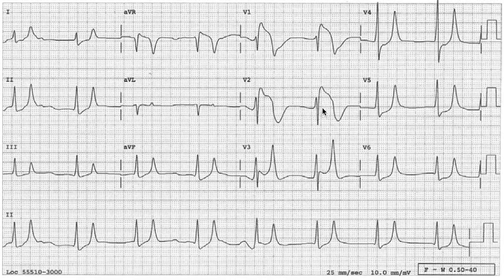This patient could be coming with acute renal failure and increased potassium. So the last thing he needs you to do is to inject him with a contrast, just to do an angiogram, because you might suspect ST segment elevation myocardial infarction here. The other reason, you need to treat this patient with calcium just from looking at this ECG without the potassium result, because this pattern is progressive, so it can rapidly progress into sine wave and ventricular fibrillation, and the patient will die.